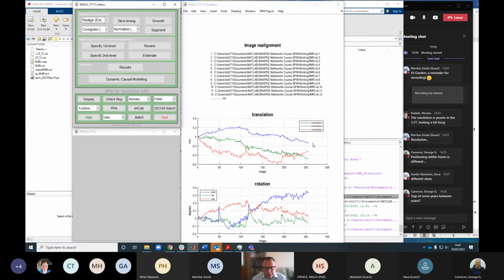So you see this particular person did really well. It was a fantastic participant, and they didn't move very much over that 10-minute period, I think this particular one was. So what we've done is we've realigned all of our data.